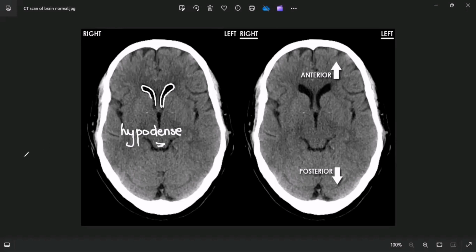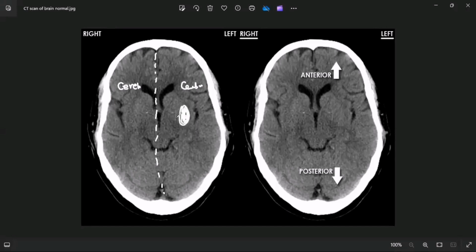Now for most students, the bone of contention is this: you know that this is one cerebral hemisphere, and this is another one. When they go to the exam and see a lesion here, they are wondering, is it on the right or is it on the left?